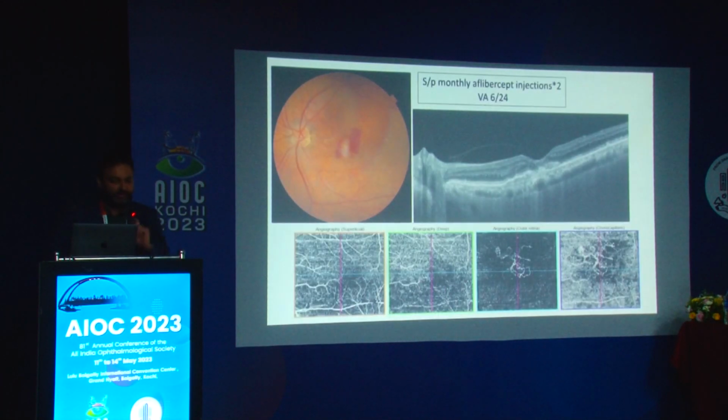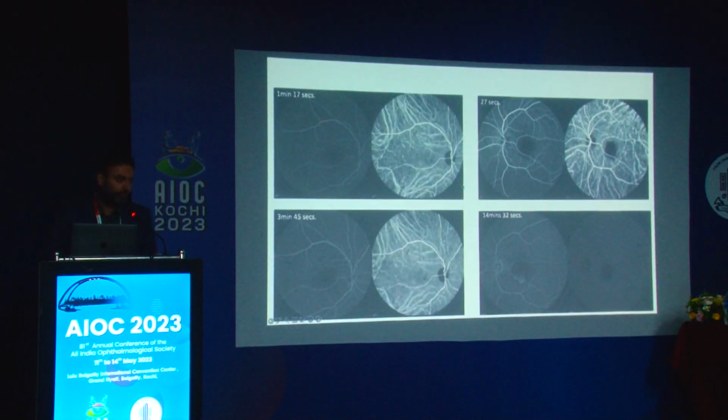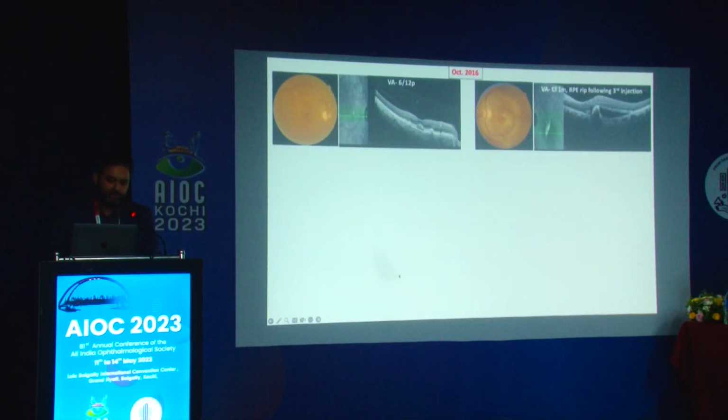can point to that. The other, which is the avascular, again, this patient had shallow irregular pigment epithelial detachments all there. I just want you to concentrate on the right eye. Was asymptomatic all throughout, but had this shallow drape of subretinal fluid beginning in 2016. Imaging, both fluorescein, ICG, as well as OCTA showed no membrane, no evidence of any activity. And again, please just concentrate on the right eye for this.